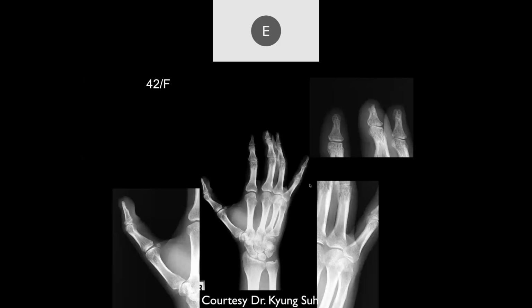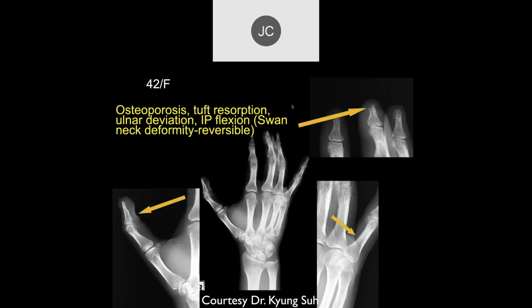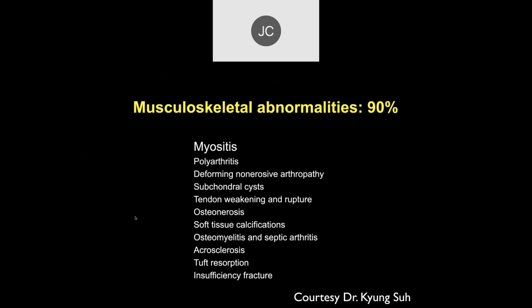Tayson, what do you think of this case? All right, so the skin around the distal phalanx of the thumb looks a little irregular there, and then there's an erosion at the distal tuft of the middle finger. And maybe a little bit of increased density in the soft tissues there. It's lupus.